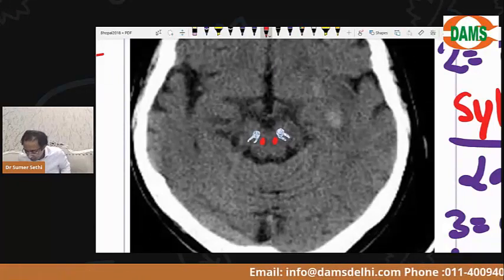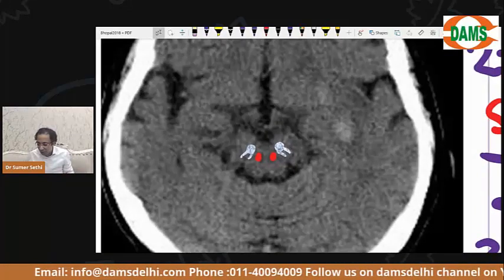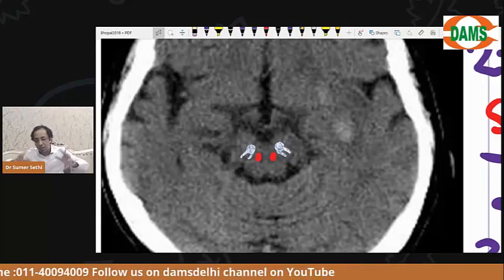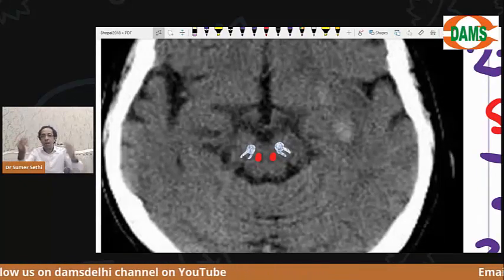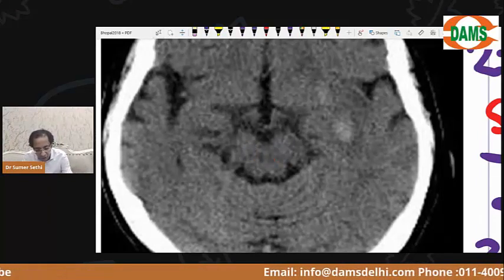Okay, very good. Now see, this is a typical question. This has been asked in NAMS also multiple times. Simple correlation. Children, you should know that if you want to see the substantia nigra, you have to look in the midbrain. Behind the crus cerebri you will find the substantia nigra. Very good, beta. Now let's see if you can answer this.